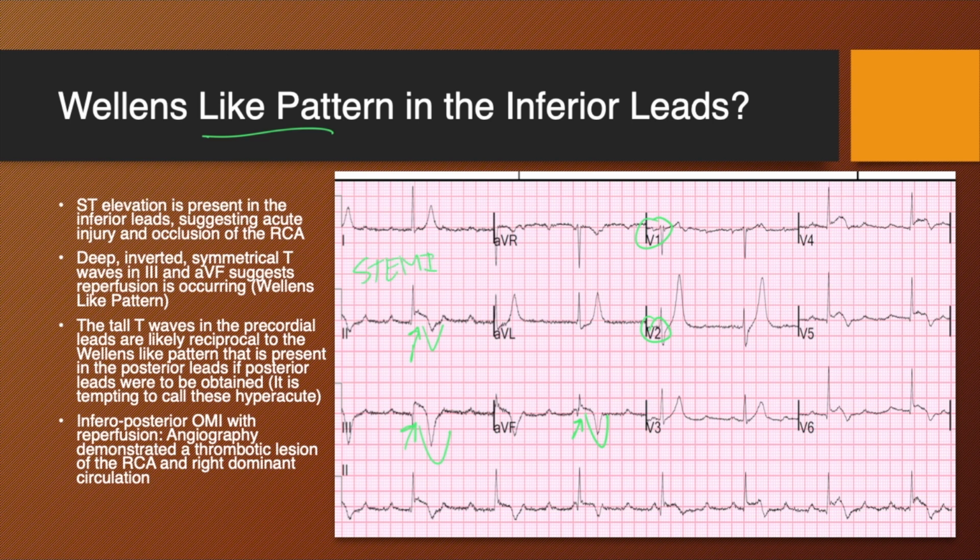You have someone who's having a STEMI, but it is actually breaking up and it is resolving in front of your eyes, and you are actually getting reperfusion occurring, right? So very interesting that you can see these dynamic changes in other situations. So I just kind of wanted to demonstrate that or show you there.